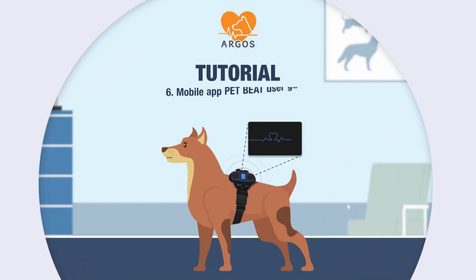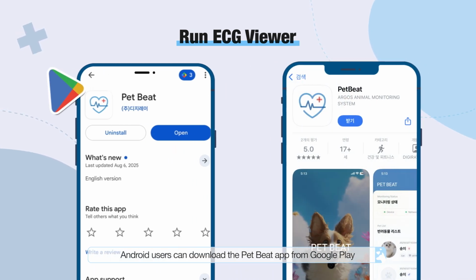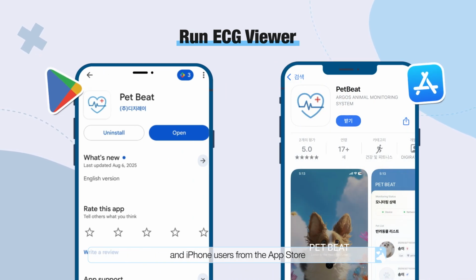This video introduces how to use the PetBeat mobile app with Argos. Android users can download the PetBeat app from Google Play and iPhone users from the App Store.